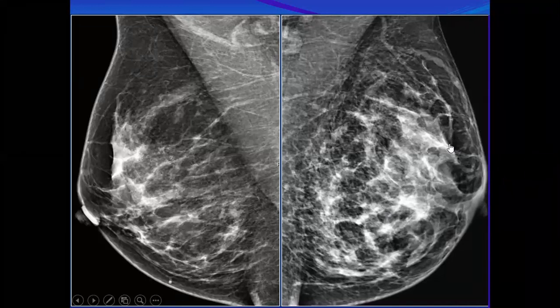I can see that the pectoralis major muscle has no clear outline. Excellent, well done. So the edema is extending to the prepectoral region. When you see breast edema extending to the prepectoral region, it is significant and gives a little bit more suspicion. Also, there is increased vascularity.